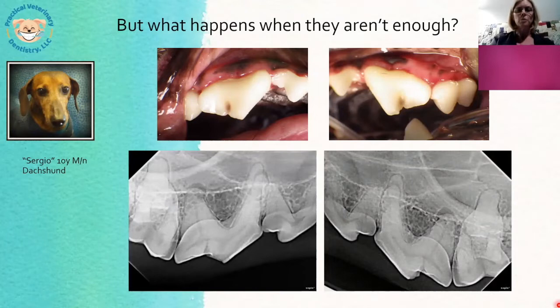So I spoke with the owner, and you can see on these radiographs that we have sort of a hint of something that could be a periapical lesion on each of these distal roots, but it's not what I would really consider a normal periapical lesion. I said to the owner, I'm not really sure. These teeth sure don't look like they would be non-vital.